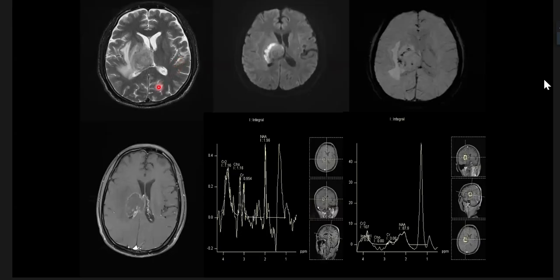One thing I want to interrupt: you said the lesion is T2 hyperintense. On what basis did you say the lesion is hyperintense? Compared to gray matter. Compared to the gray matter, do you think it is hyper? I'm talking about the lesion. So it's iso to hyper, sir. Very good. So the major component of the lesion is matching with the gray matter, and the central part, which is brightish, is a little bit hyperintense compared to the gray matter. If you see the major portion of the lesion, it is matching with the gray matter, correct? Yes, sir. Okay, so continue the description.